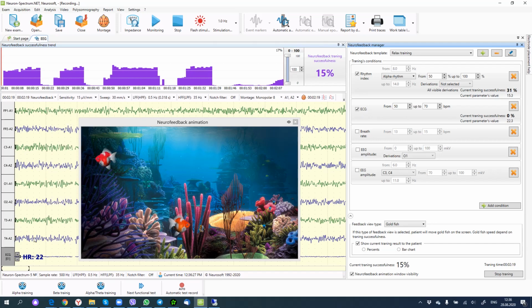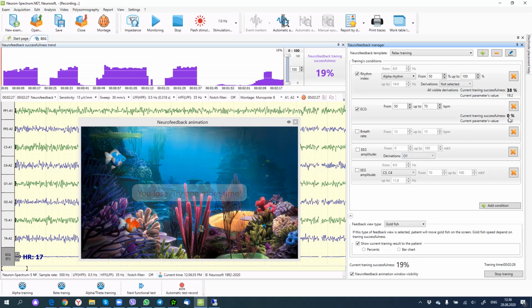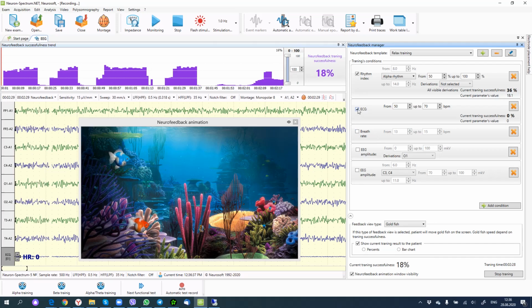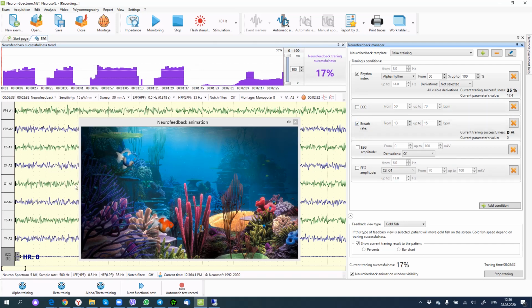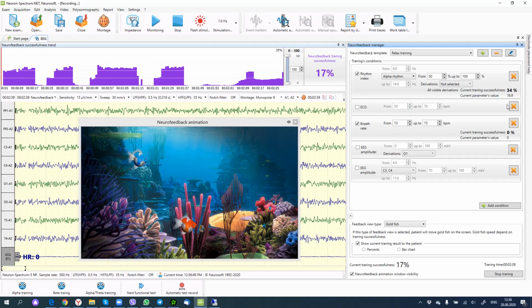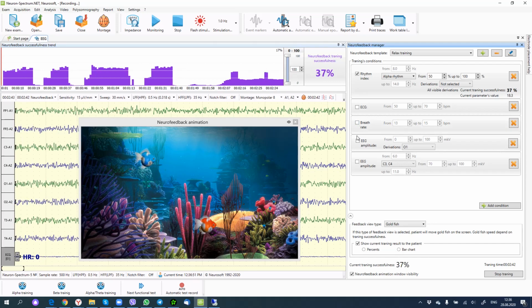Unfortunately, we have no ECG signal, and heart rate is calculated not so good here, and successfulness is about 0. We can switch it off. What about breath rate? Also, we have no breath signal in our current montage, and the successfulness is 0 here. We will switch it off.